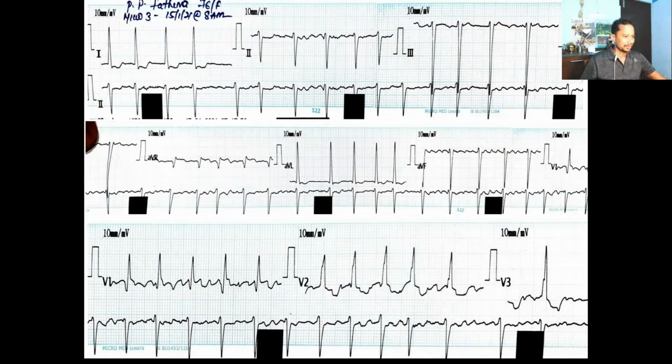I have to relax. And now see, I have always told you before, if something is positive in AVR, something is very bad occurring in that ECG. Out here, ST is elevated. Okay, so ST is elevated, and there's a lot of abnormality at the atrium levels, and there is an interventricular conduction defect. You can see this notching of the R waves. So that is called IVCD, interventricular conduction defect. Okay, right now we are at the atrium.